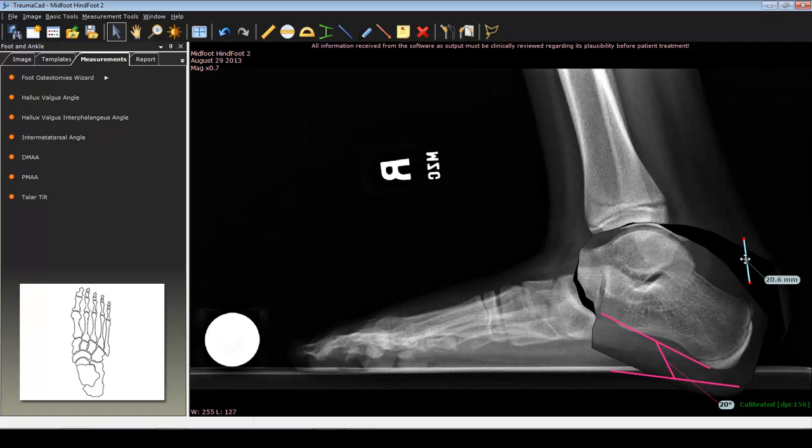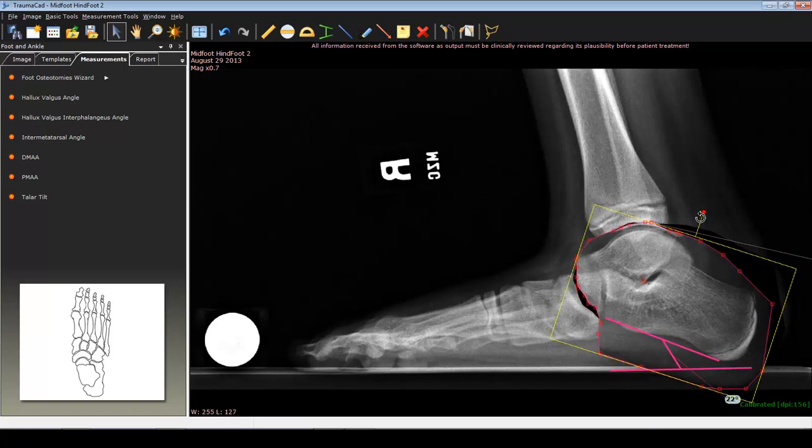Obviously we've decided that our soft tissue correction is going to be done more proximally. So we can stop at that. All right, let's adjust our lines. Make it back to 20 degrees, because now that this line is in the center of that fragment, it keeps adjusting, so you always have to be mindful of that. All right, so 20 degrees is that.